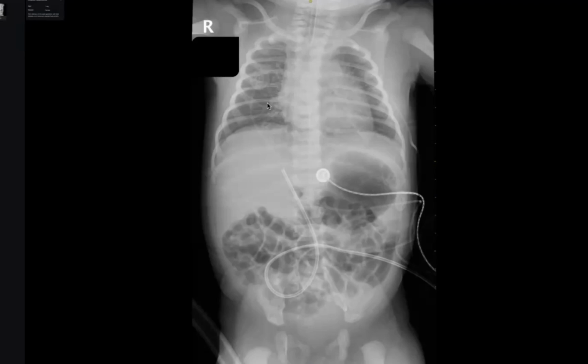It may also cause chemical pneumonitis. Yes, and also chemical pneumonitis. Okay, thank you, doctor. So my colleague, when you see this, it is a babygram. Don't tell the examiner this is an abdominal or chest film. This is a babygram.